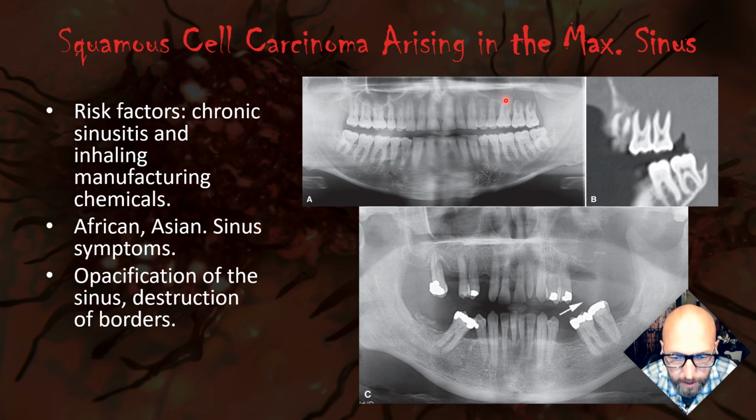Although if you look very closely at the bone here, I think the malignancy has destroyed a lot of the bone, eaten into the marrow space here. So I would call this ill-defined. Definitely I would call it ragged. I would call this teeth floating in air, but does it look like your typical periodontitis? Hopefully you recognize it does not.